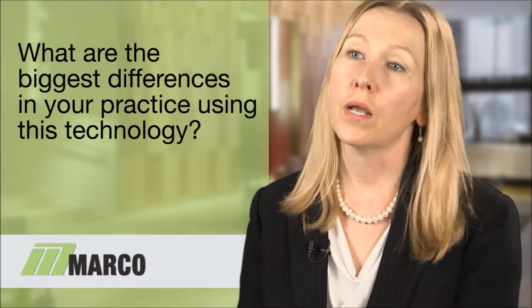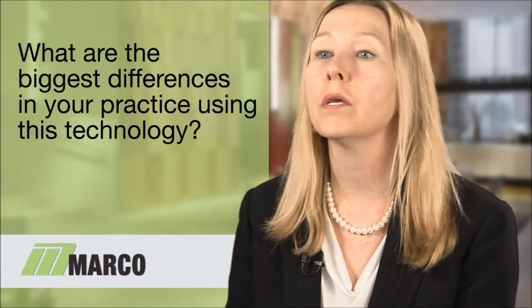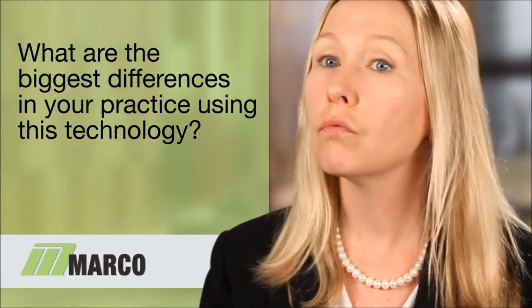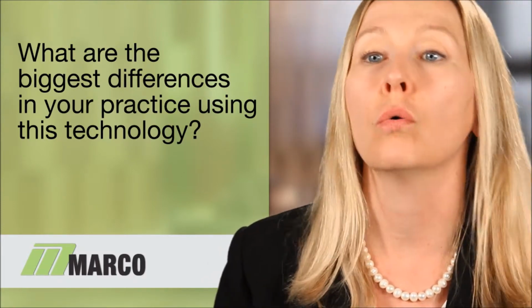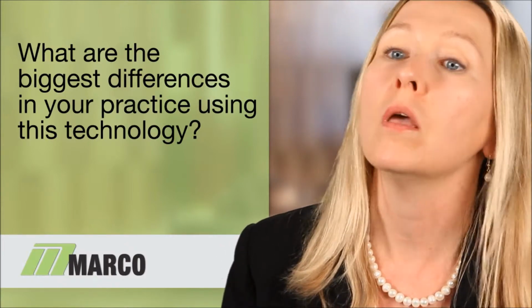Another way that OPD has been very useful is in patients who are getting multifocal implants. We now look at the angle kappa of these patients, look at their pupil size, and look at where their aberrations are coming from. The nice thing with the OPD is that it really splits up the cornea and the internal portions of the eye and lets you know where their aberrations are coming from and whether or not they're going to do well with a premium IOL.